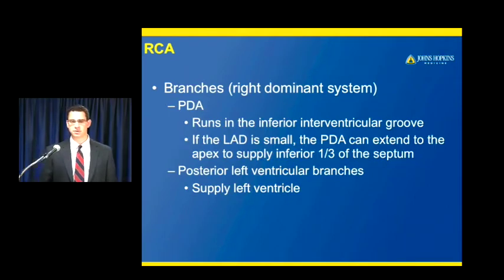There are also usually some extra branches to the inferior wall of the left ventricle called the posterior left ventricular branches or posterolateral branches. PLB is one abbreviation you may see, and these supply the inferior wall of the left ventricle as well.